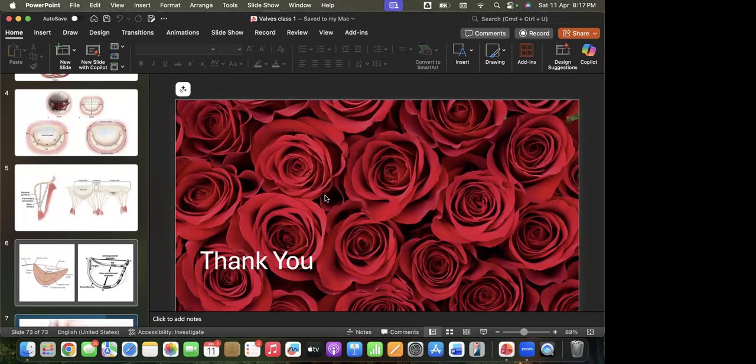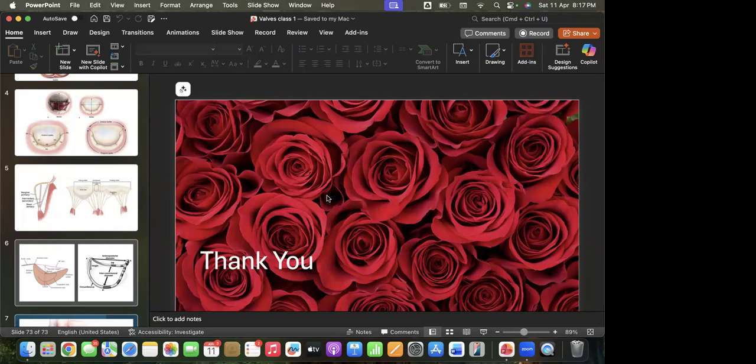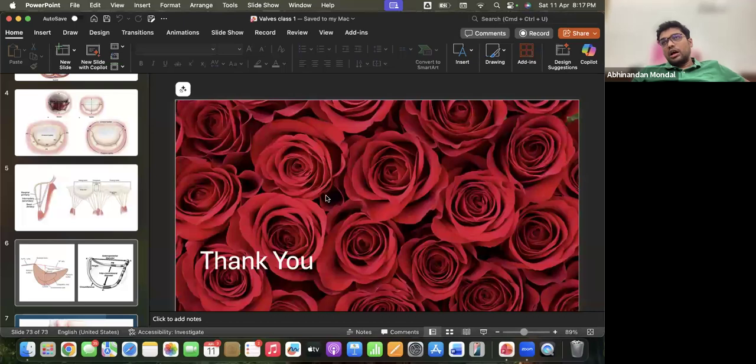Yes, that's very true. Before coming to a conclusion, we have to see all the images of that particular structure. We cannot see one image and then conclude a decision. It should be given after seeing all the images, because it can be normal in other images, and that might be an artifact. Yes, ma'am. Also, we are dealing with a pathological heart, so it is not possible to see only particular scallops at a particular omniplane angle. We have to keep on rotating in every possible angle so that we can understand more and more about the valve.